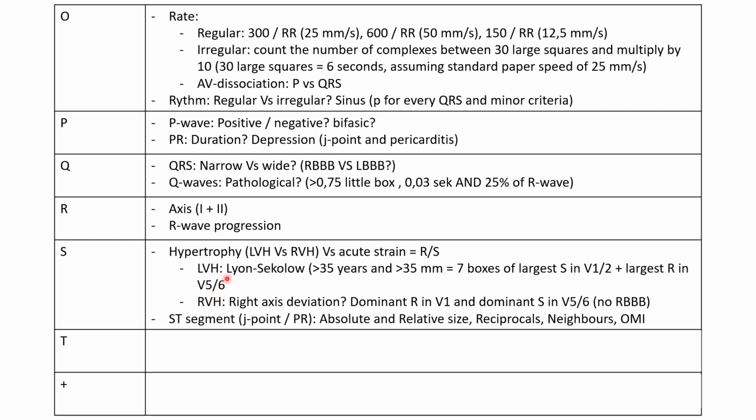And so LVH is usually a lot of this, and this is not diagnostic for left ventricular hypertrophy. It's just the hypothesis, and then you have to go do your work. There are other criteria beyond that, but if they live up to this, and this is like the V1 to V6 criteria. There's also other criteria, but for screening purposes in the emergency department, I think this is enough.